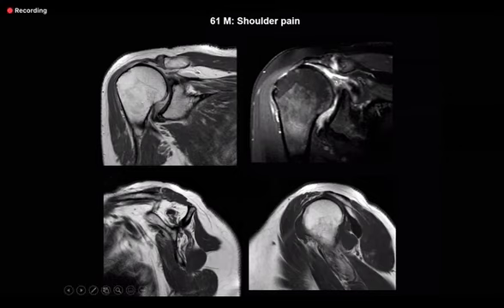Fine. The main point is that this is the glenoid and this is the head of humerus. Now you can see that there is superior migration of the head of humerus in relation to the glenoid. In an exam case, they will show it to you on a plain film, for example rheumatoid arthritis, where there will be superior migration and there might be some clavicular erosion also. So please remember this concept that you can infer a full thickness tear or a massive tear just by looking at the configuration of these two and the history.